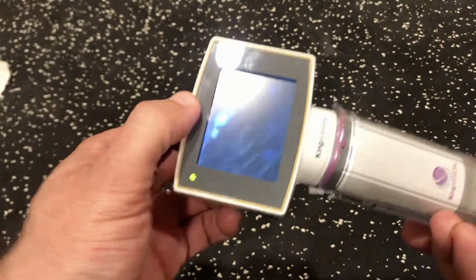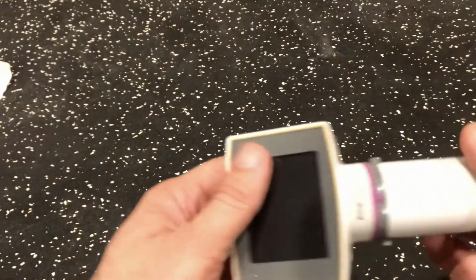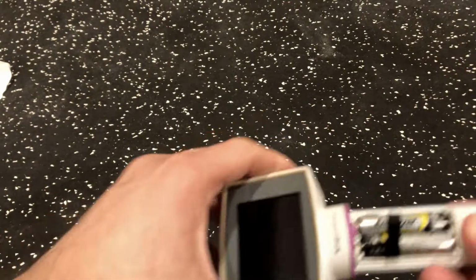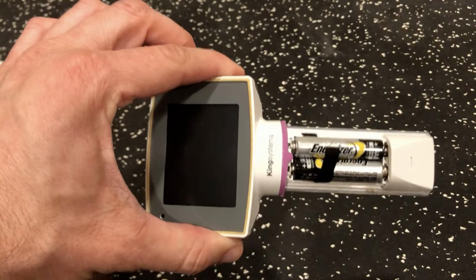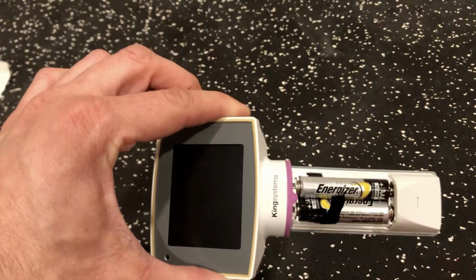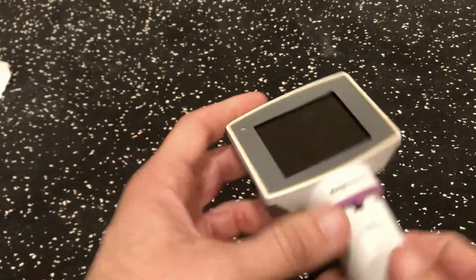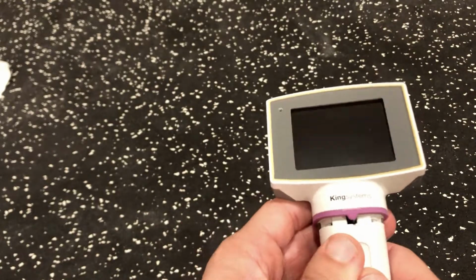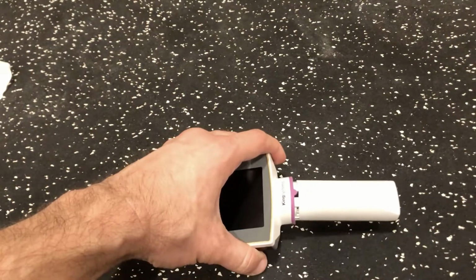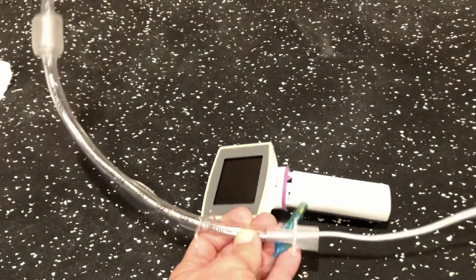This is the video laryngoscope, probably the most important thing for our purposes, and what is really important for you guys to understand is to make sure this video laryngoscope has batteries. So about every 6 months we want to check them. There's actually 3 batteries. The last thing we want to be doing is trying to put batteries into a laryngoscope in an emergent type of situation. Anyway, these are some of the common endotracheal tools and airway intubation tools that we have in our office.